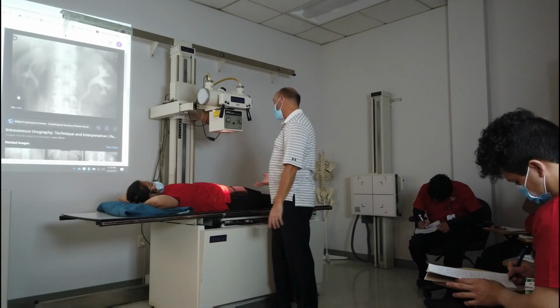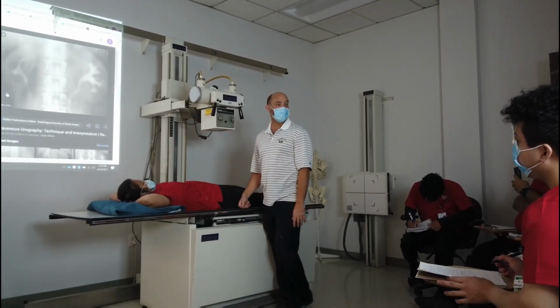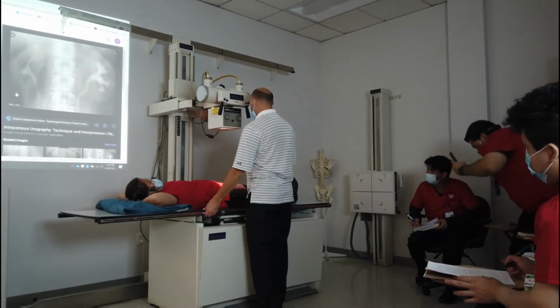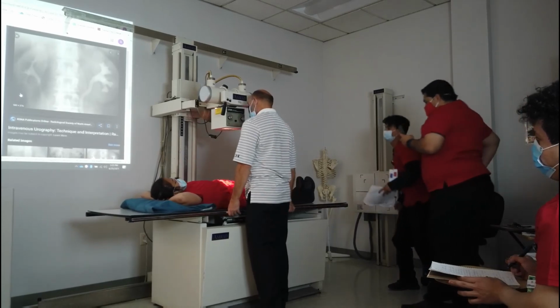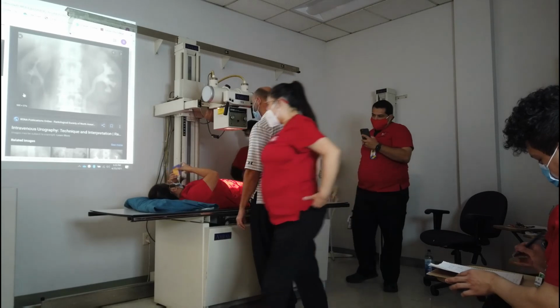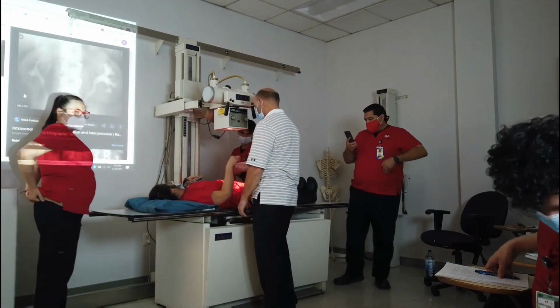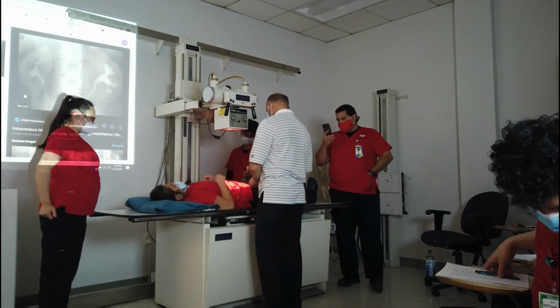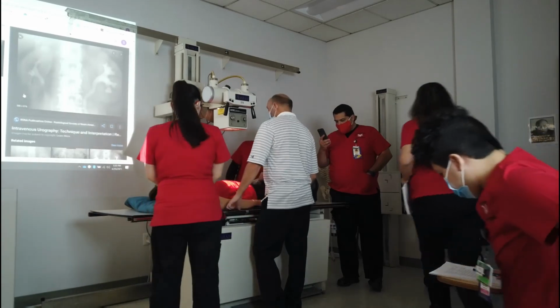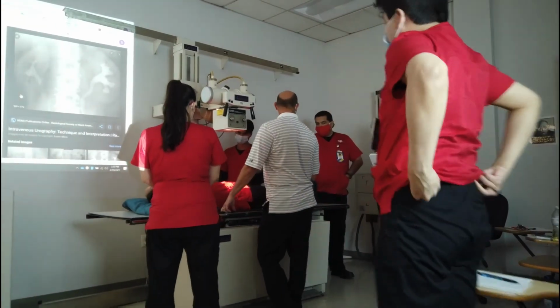That depends on your patient size. If you have something small, you can get away crosswise with a 10 by 12. Okay? So basically we're just looking at the kidneys. Use the larger 11 by 14 for larger patients and 10 by 12 for smaller patients. So a kidney scout or a nephrogram.